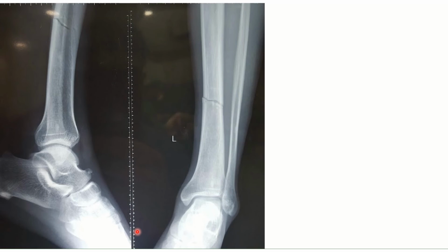So coming to the third X-ray, again here the side is mentioned, left side, but the name and dates are not mentioned. So you have to first of all identify the patient. Now, supposing that you have learned the art of presenting the X-rays, we'll just try to learn how to read this X-ray. So here this is an X-ray of a skeletally mature person of the left side, showing the leg and ankle.